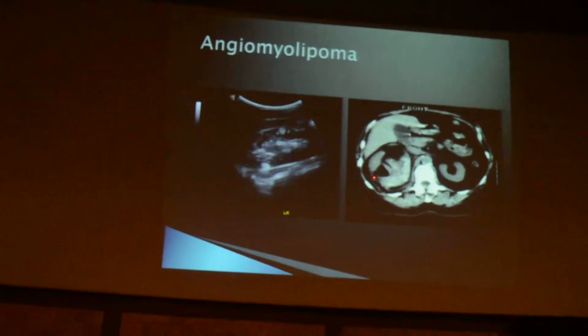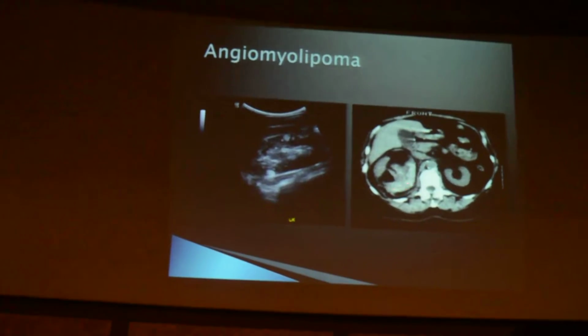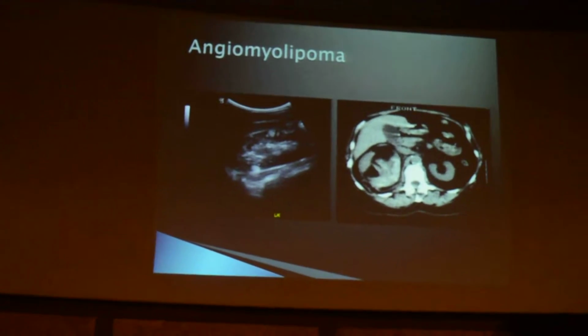So this is a homogeneously enhancing lesion, except for the fat component within it. It is not as aggressive as a renal cell carcinoma and shows homogeneous enhancement.